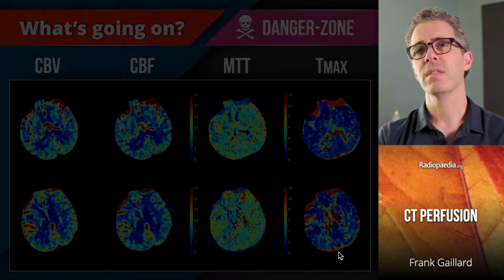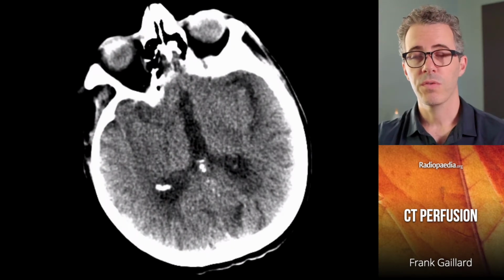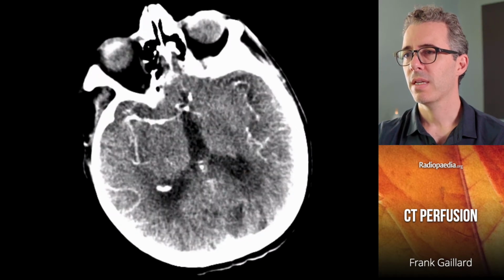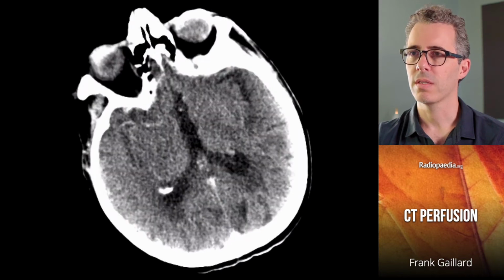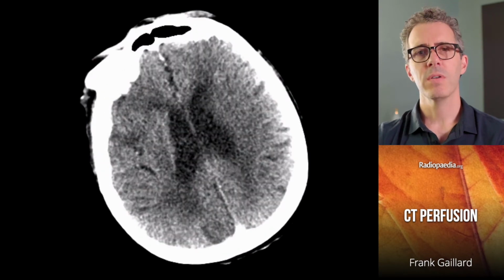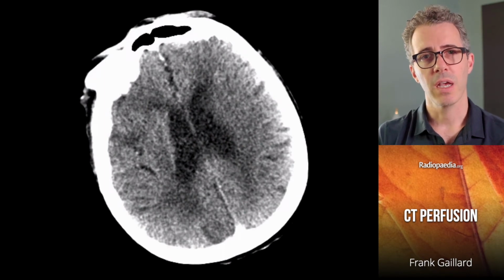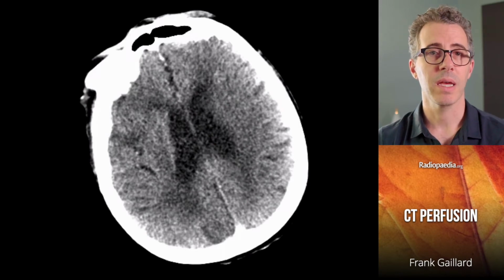And once more, this is where looking at the perfusion data is really helpful, because as we scroll through the perfusion of this particular patient, we can see that they move their head from side to side during the perfusion scan. This is at one level, and this is at another level. And because these maps are looking at values and how they change over time, any movement during the scan can cause tremendous impact and artifact on the final maps generated.